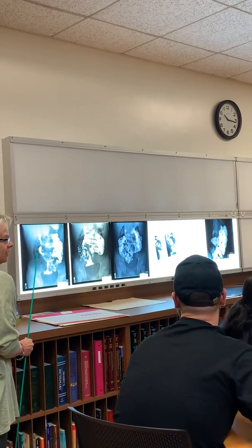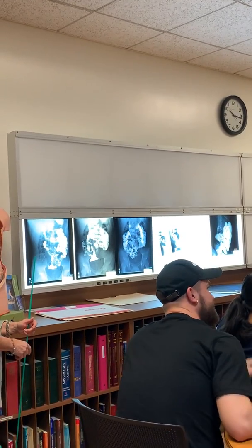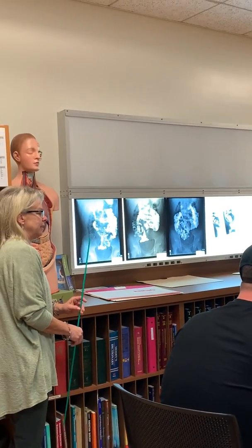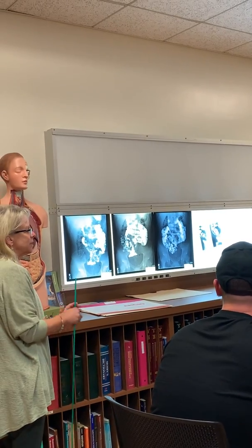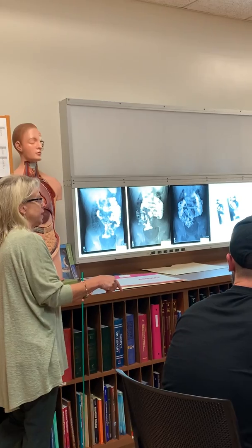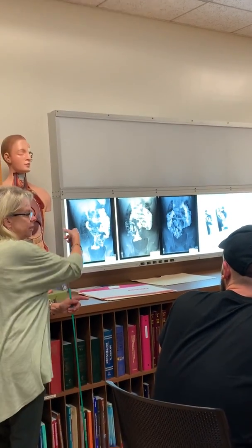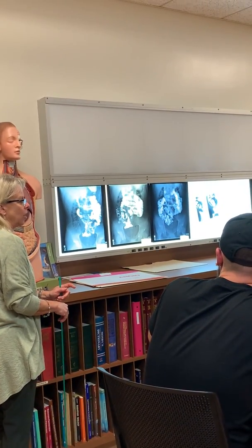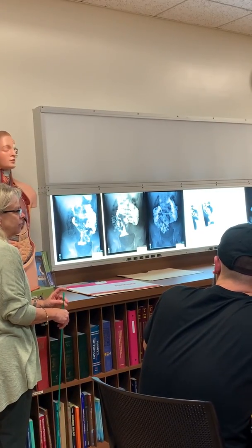They said that they couldn't eat before they had the study done. It's usually NPO after the evening meal for small bowel studies. Is that the same with kids too? It varies, sometimes they say after midnight, so it all depends. If they have a GI with it, then it's usually after the evening meal that they can't eat anything. Did they do a GI first and then a small bowel to follow? They just did a small bowel. Then it all depends on your facility.